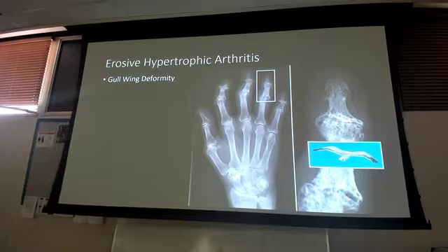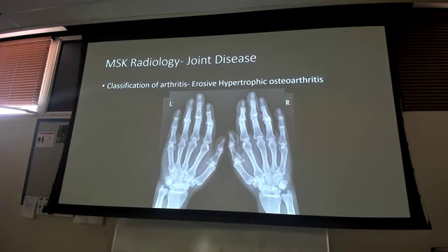So the diagnosis sounds like an oxymoron, it's really because both are happening at the same time. But the hypertrophy is what stands out more on the x-ray, and then we use that gull wing deformity in the joint spacing to really kind of give that to us in a perimenopausal woman when you get age right, and you're looking for this most commonly.